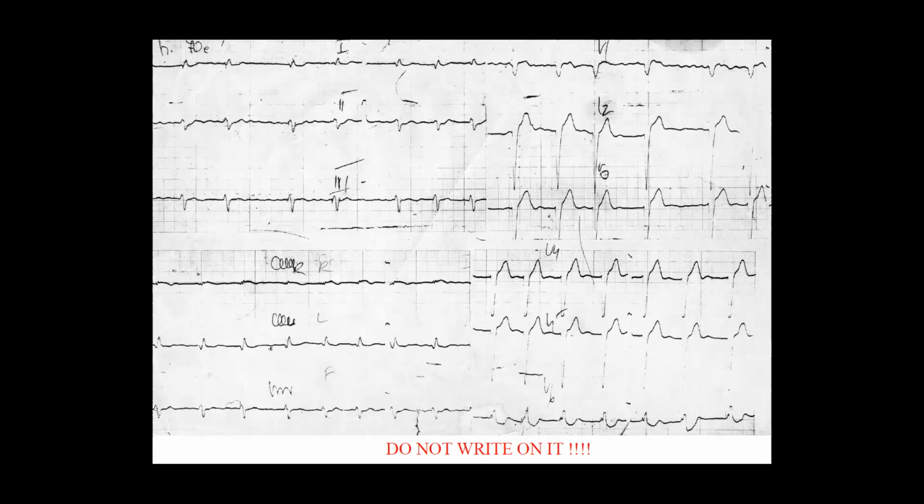Okay. So rhythmic or not? I mean, the beats are coming, but not all of them are at the same distance. So I don't know, do I count that as not rhythmic or rhythmic? Look, if it's a little bit off, it's okay. All right. This is a rhythmic for sure. You can see it. Yes, it's rhythmic. Okay, good.